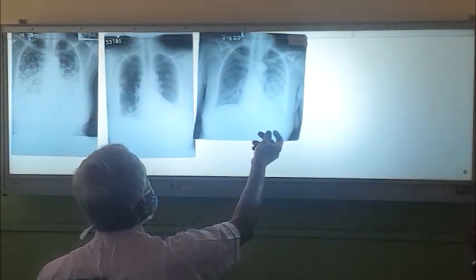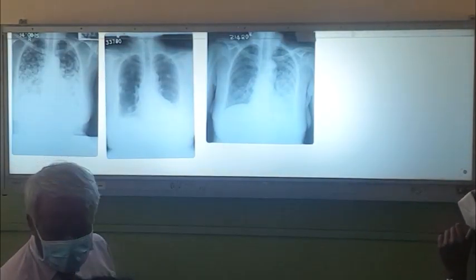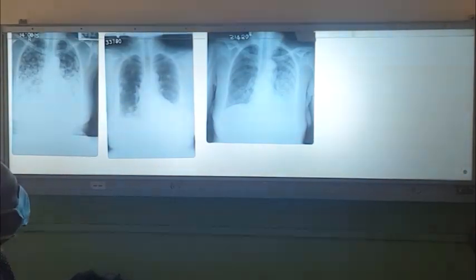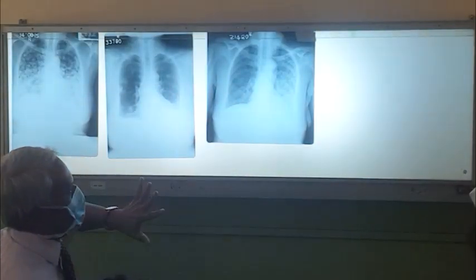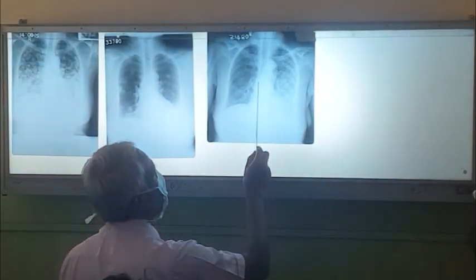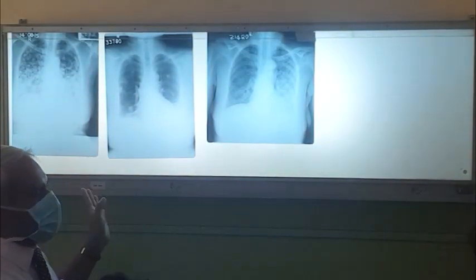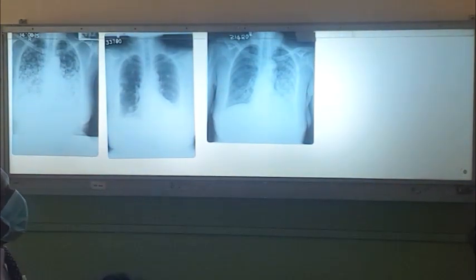Some poor quality X-rays, right? So this is what is called miliary, 2 mm or less, widespread opacity, right? This X-ray is well centered, but you can't see the intervertebral spaces through the cardiac shadow. So this is an underexposed film, right? And maybe an obese female patient, you can see the thick chest wall, with miliary mottling, right?